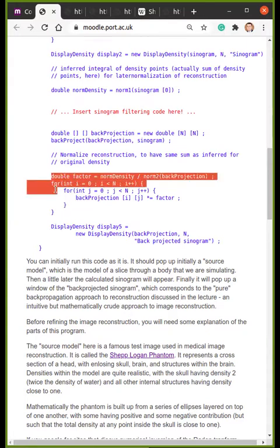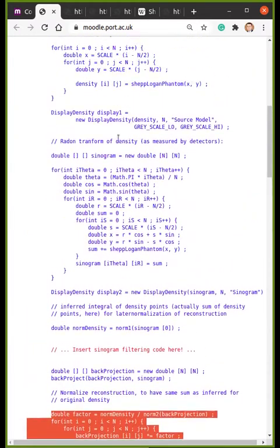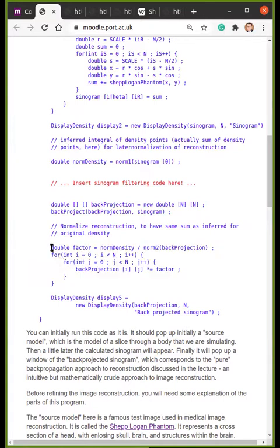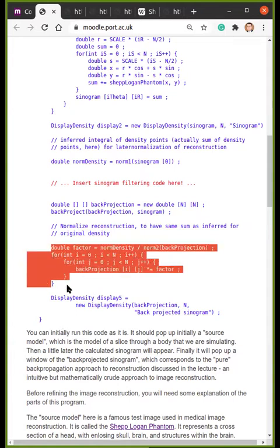It's just a pure normalization, because here the range of densities is in a particular interval. So we normalize this projection to somehow normalize each point in the obtained density function. So this is a kind of normalization step, and as we can see, we apply it to the densities before displaying the back projected sinogram.